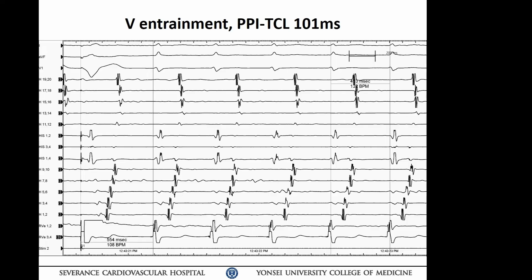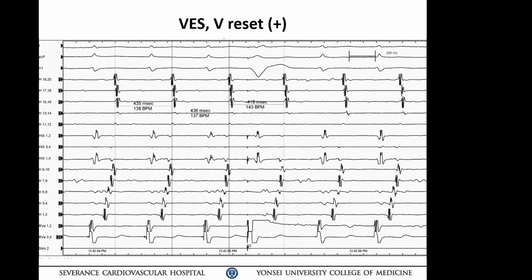So in the pre-entrainment pacing, we reset. In this case, the His-refractory PVC advanced the next A. But I think another very important piece of information is the next V interval, whether it changed or not, because in a bystander case, the next V cannot be advanced.